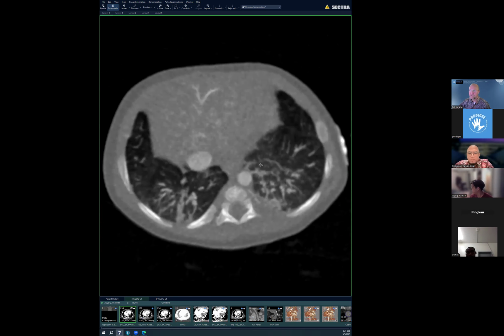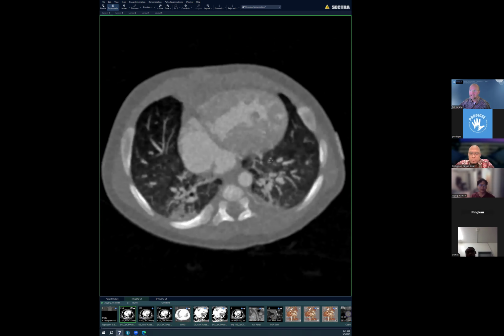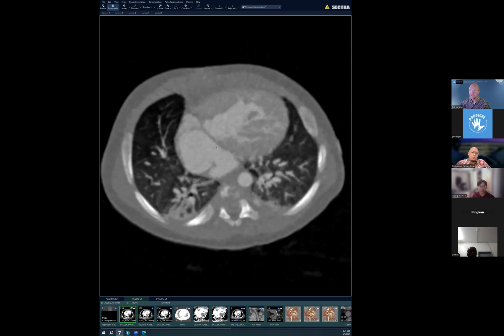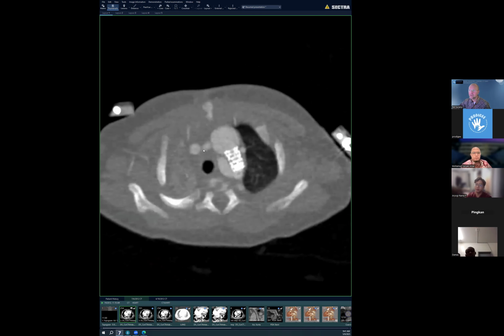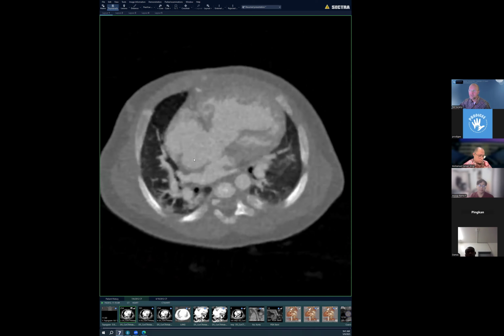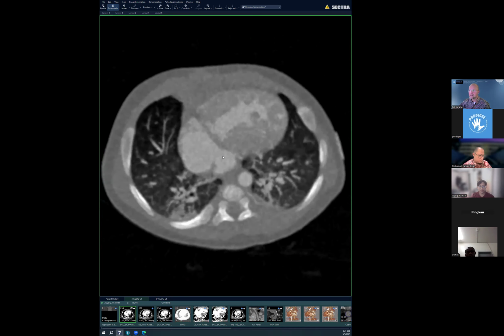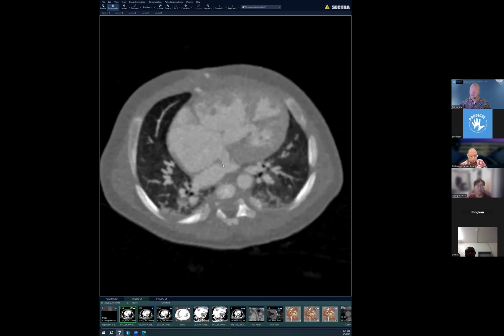So we've sent out the blood to the systemic circulation. Now we're going to collect it back through the hepatic veins, IVC, draining to a normal appearing right atrium. We have the SVC superiorly, draining to the right atrium as well. And we have a coronary sinus that's hard to see. We also have a septal defect here.